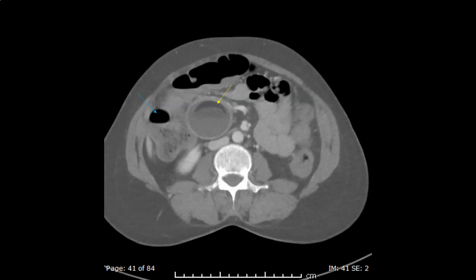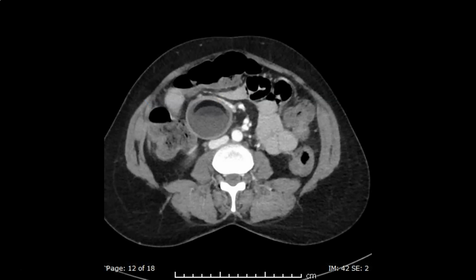The question has been if this is a retroperitoneal dermoid or a mesenteric dermoid, because a retroperitoneal dermoid is very unlikely to be a cause of pain, considering that it is fixed to the posterior abdominal wall, and in this case we may need to search for another cause of the acute abdominal pain. On the other hand, a mesenteric dermoid is very likely to cause pain because of its mobility within the abdomen.